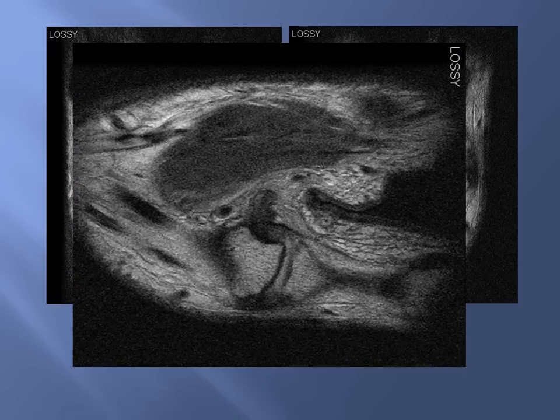And if we turn this view to the orientation that you would see with ultrasound, you'd be imaging the long axis of the finger with the transducer. And you see the ulnar collateral ligament 90 degrees to the metacarpal head, proximally retracted and balled up above the adductor aponeurosis, depicted here in green. So there's the ball and string appearance, or yo-yo appearance.